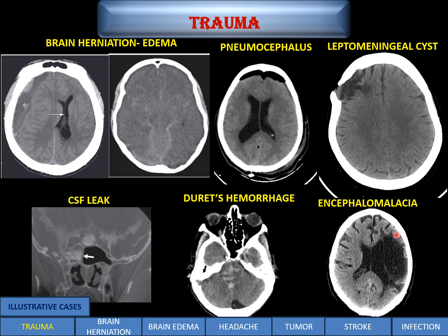Encephalomalacia is when we are able to see large or small areas of atrophy of the brain with replacement of the brain tissue by a CSF kind of appearance. That is encephalomalacia, which is a sequela to any insult, be it an infarct, be it a trauma, be it a hemorrhage.